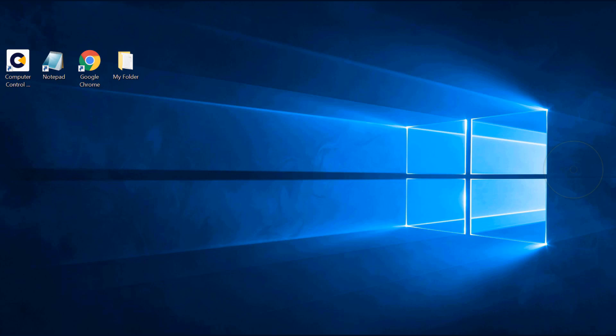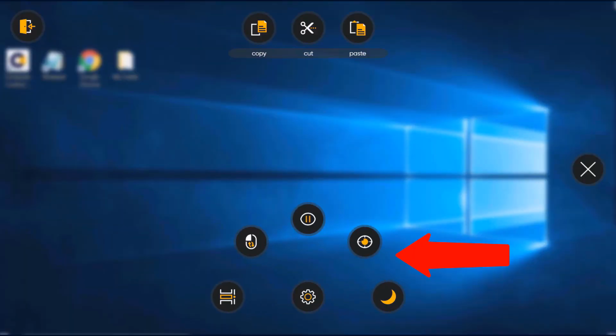For more options such as adjusting settings, pausing, or even putting your device to sleep, all you need to do is gaze down off of your screen area to bring up the More button that opens a screen with the Off-Screen menu, the Exit button, the Shortcuts panel, and the Close button. The Off-Screen menu contains the Windows timeline, continuous click, pause, quick calibration, sleep, and settings functions. Again, look how much easier it is with the wedge-shaped tracking regions.